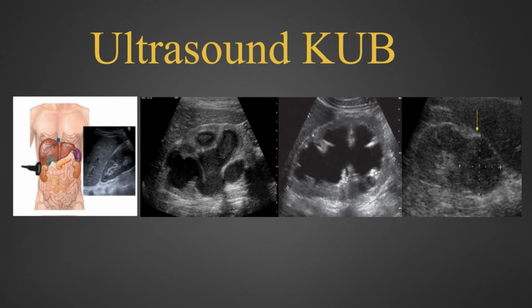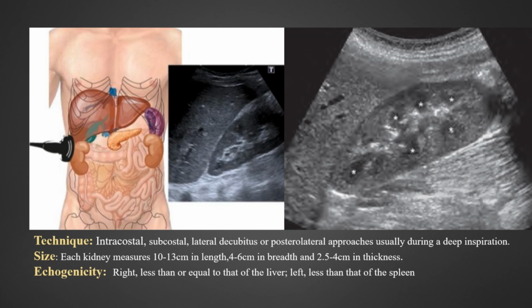Today we are going to discuss the ultrasound KUB. In this video we will discuss the ultrasound of kidneys, ureter and bladder. So first of all we'll discuss the technique used to evaluate the kidneys.